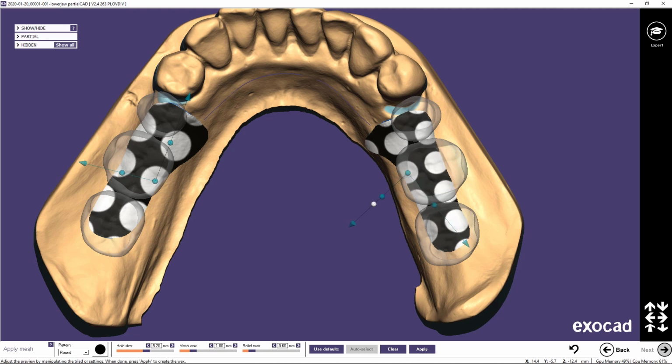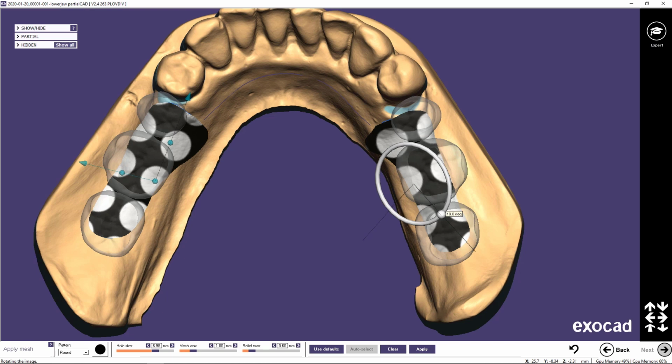When placing your retention mesh, I recommend paying close attention to your acrylic dummy teeth that you can see as a reference. I aim to place the retention in a way that the black areas, which later will be the wax, are placed underneath the acrylic dummy teeth, so in the approximal contact points you don't see any metal later on.